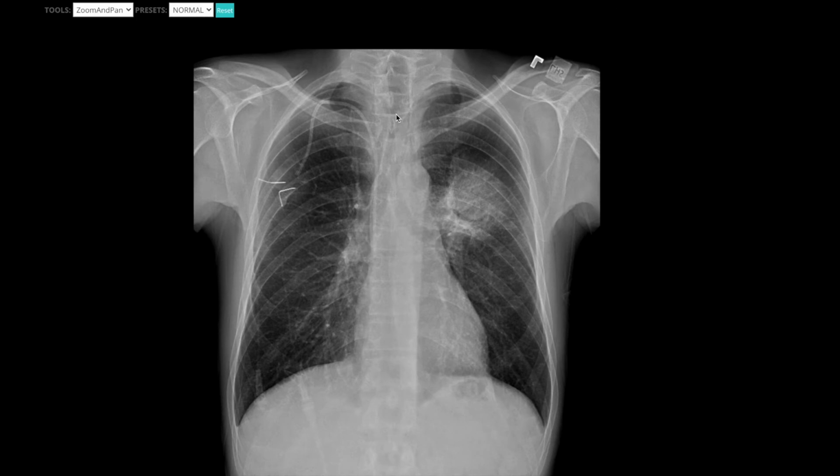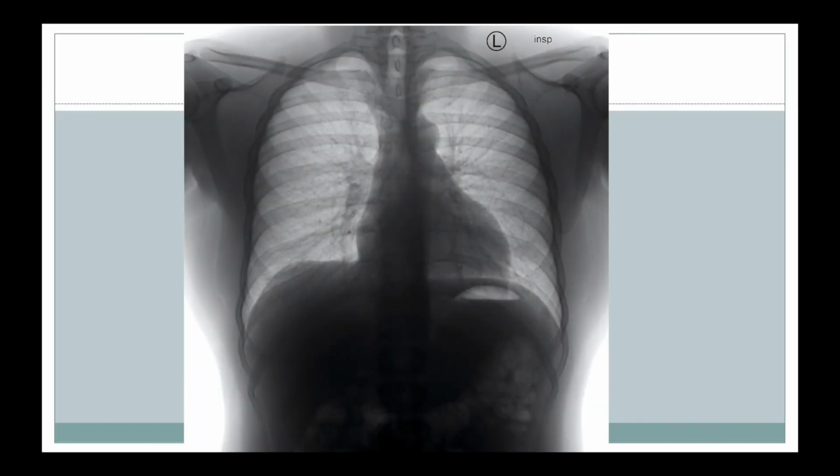I want to give you an example of what I mean by that, and also looking at it in another way. So one thing that I find to be very helpful when looking at these chest x-rays, specifically for pneumothoraces and also for fractures, is inverting the image. So I'll look at it first just in the normal projection. I'll zoom in on the apices, zoom in on the bases, and then after that I'll invert the image and look at it in this other way. The reason why this is easier is because the pleural line is usually dark, and then the pneumothorax is going to be more bright or light colored.